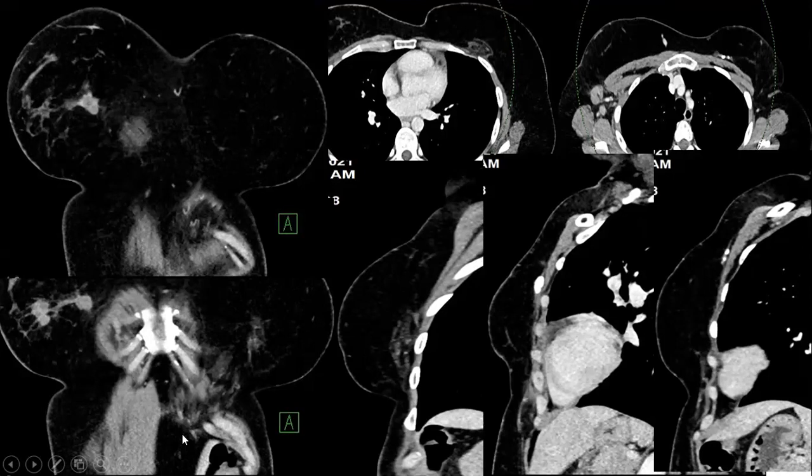It's missing. Can you see it reflected? Can you see it here? Reflected, but it is atrophic. Reflected because it's not working. Reflected here. You see, this is the muscle. It is reflected. The CT is helping us even to show the muscle flap.